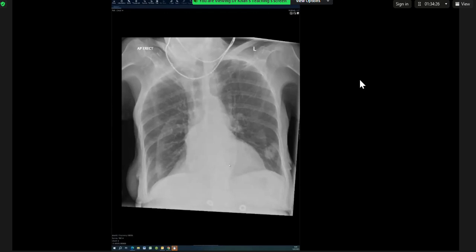And unfortunately, the one cancer that we will all miss more than once in our reporting life is lung cancer, and it will be on a chest X-ray for exactly the same reason. Incidental lung cancers are picked way more than cancers from 2-week wait pathways because of how much there is and how late they present. So when I want you to approach a chest X-ray, I want you to pick all the abnormalities and start defining them.